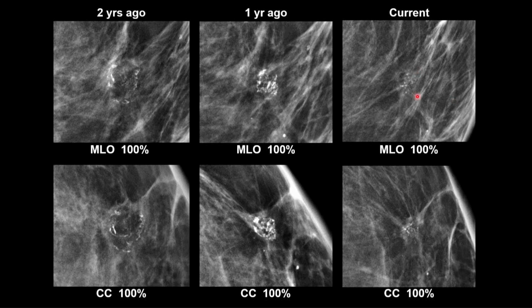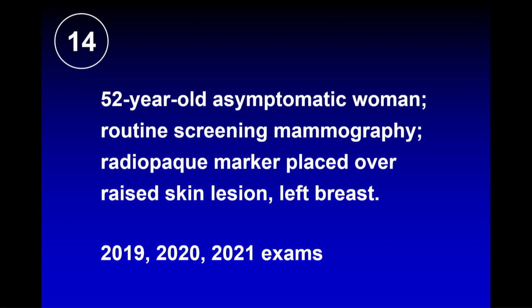Even though these calcifications are suspicious, we've got proof that this is benign. It's just oil cysts that went away with some residual calcification. So the prior exams did avert recall. When you get this, it's a BI-RADS 2. So remember, when you don't have priors and you're going to get a recall, add that sentence. Comparison with prior examinations may avert recall, or something like it, and have it worked into your system. Okay, case 14.